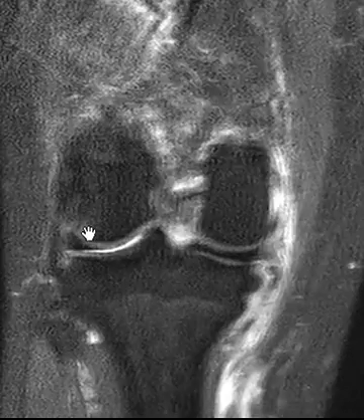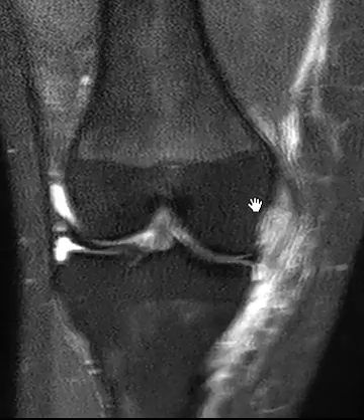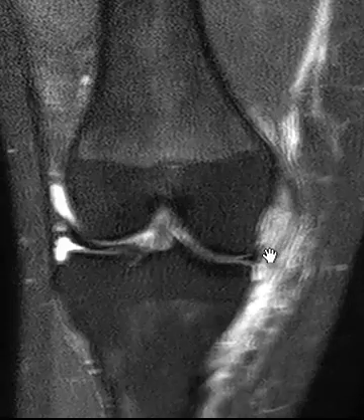And if we look over here, we're going to look for that impaction injury. Very subtle impaction injury here, just barely discernible. But again, the same day, different patient, similar age, with the same mechanism of injury.